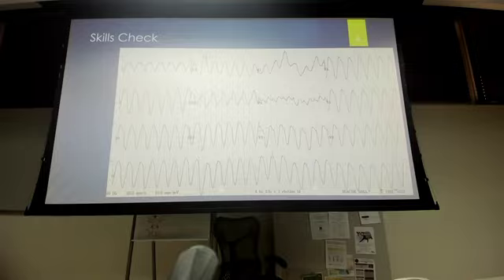Think about three or four slides higher than that. And we have one that's a fast rate, and then we have one that's a super fast rate. And the flutter. What is this one?